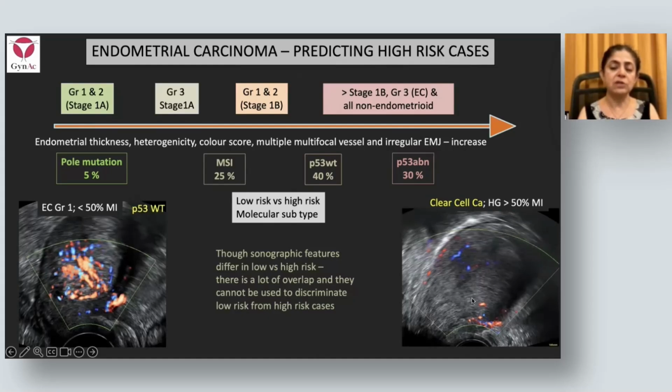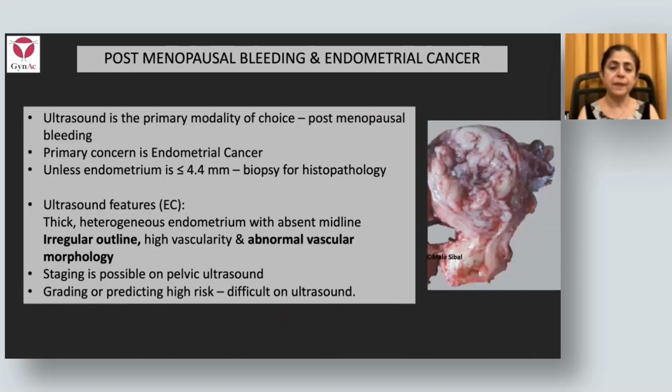But you can see here the vascularity was much lesser than what we saw over here. And therefore, just ultrasound cannot be used to differentiate between low risk and high risk cases.